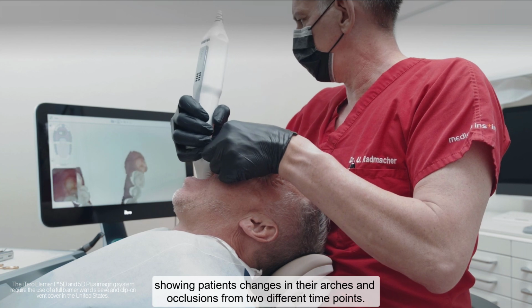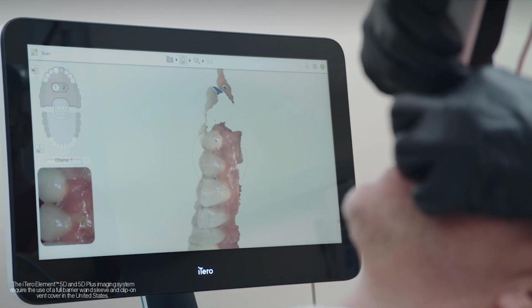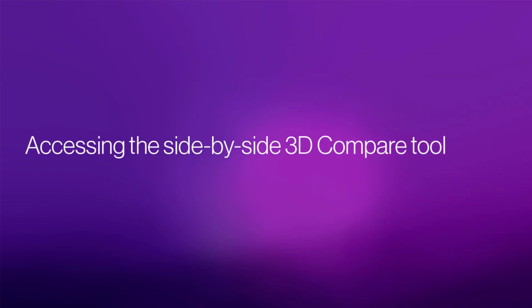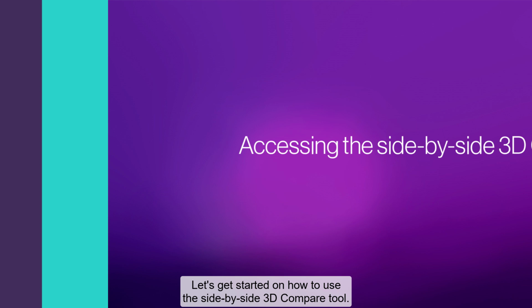Showing patients changes in their arches and occlusions from 2 different time points aids them in visualizing oral health changes and potentially increases treatment acceptance. Let's get started on how to use the iTero Side-by-Side 3D Compare Tool.